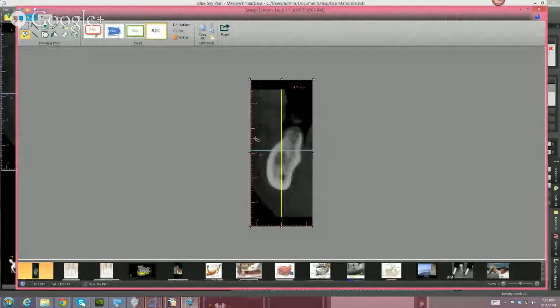Okay, so sometimes what might happen is that, let me get a pen. Okay, so instead, the submandibular fossa may go, whoops, that's not what I wanted to do. Okay, this is what I wanted. A nice red pen, just like the English teacher used to write.